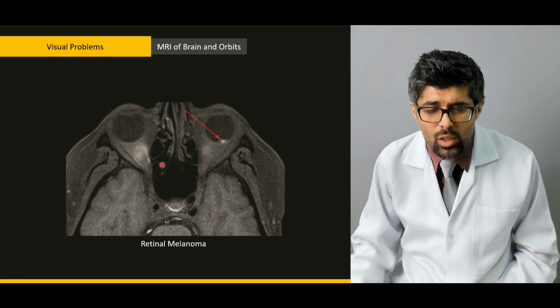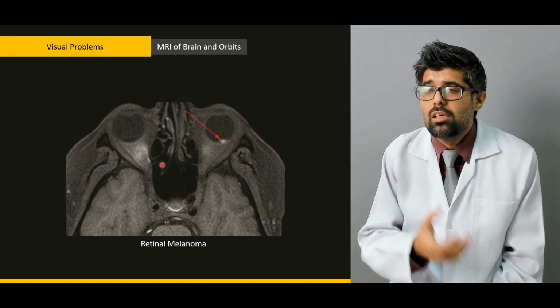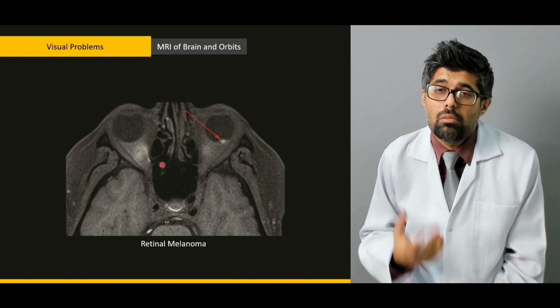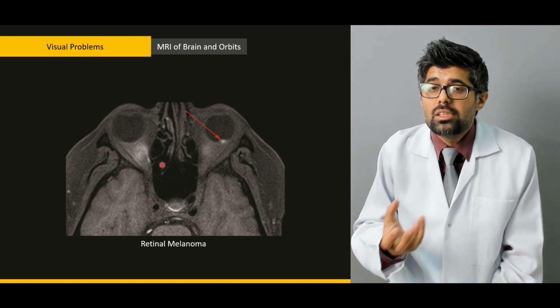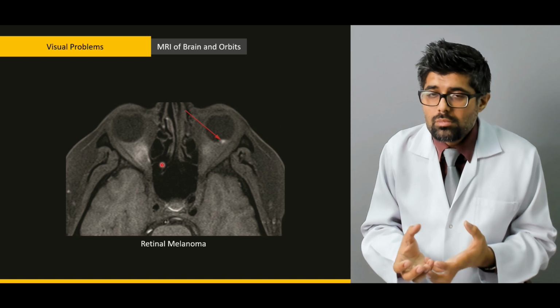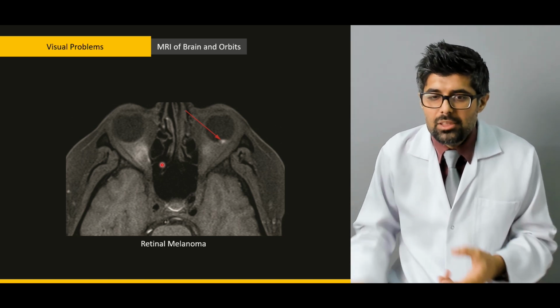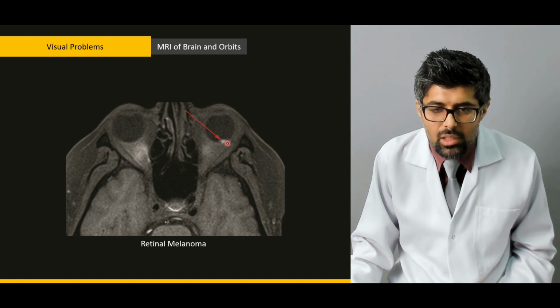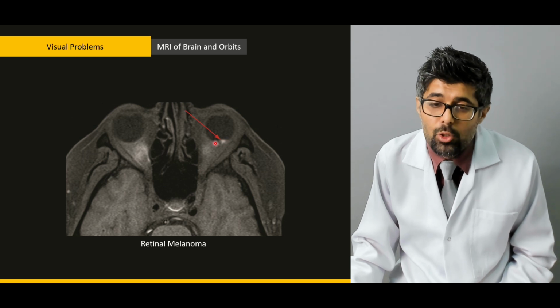Here, one of the common malignancies of the retina is a retinal melanoma, where melanin containing cells metastasize or convert into a cancer. This little area here is a retinal melanoma.